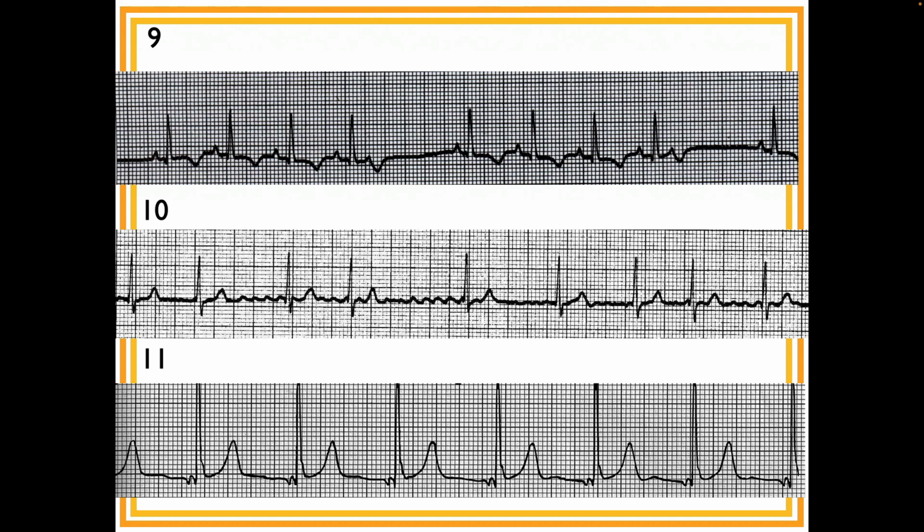But if you look at the 4th beat, also the 5th, 6th, 7th, the 8th beat, it doesn't look like that, because there's a little bump right here, just like that. And that makes it look different. See that little bump? It's not the same as these. So you have to say, well, what exactly is that?